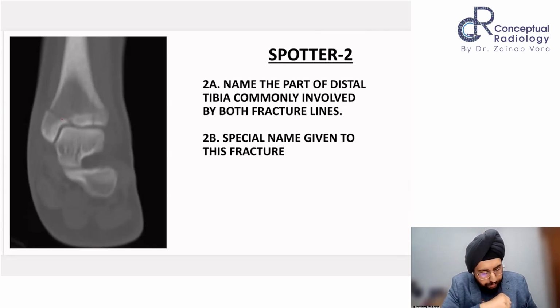So this part is basically being commonly involved, that is the distal articular surface. So what do you call this part? We call it the tibial plafond.